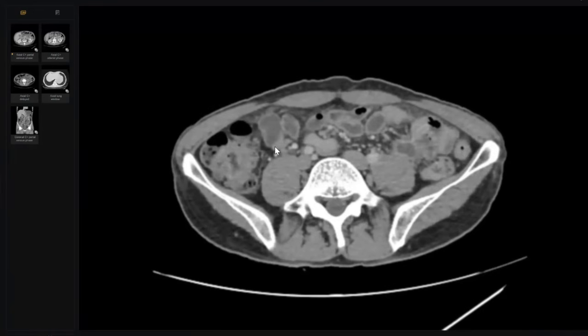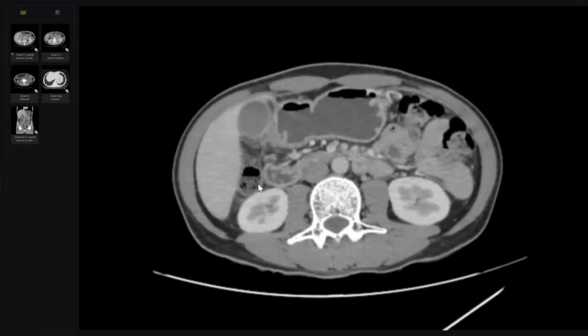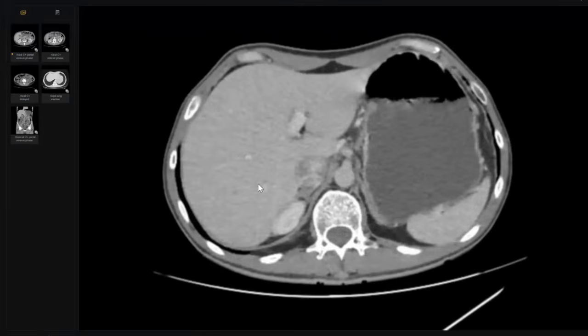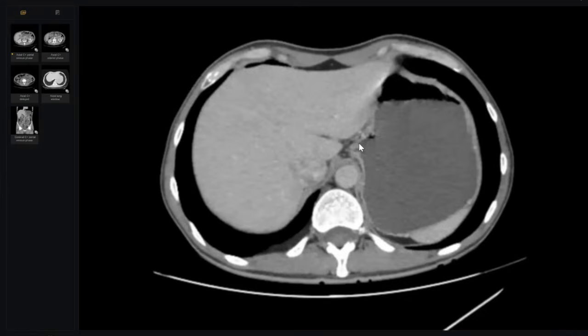I have seen this twice in my career, misdiagnosed as appendicitis. So you may be presented with right iliac fossa pain with a normal appendix, and you should go up to rule out any pneumoperitoneum and perforated duodenal ulcer.